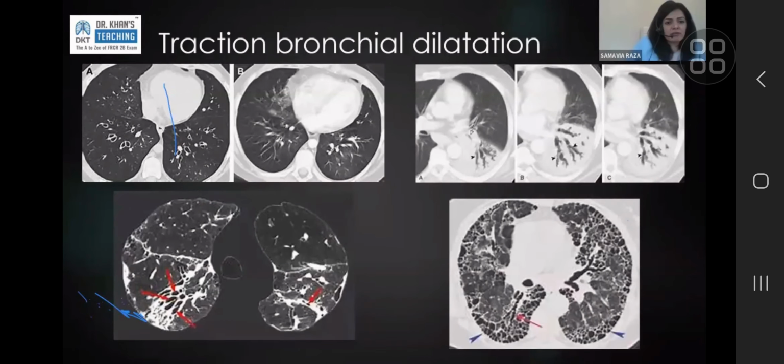So this first slice on the top is primary bronchiectasis, because you can see that the bronchi are dilated, but there is nothing around them to cause that. So is there anything to explain in the lung that the bronchi are dilated? No. So you have to, as an exclusion, say that this has to be primary bronchiectasis.